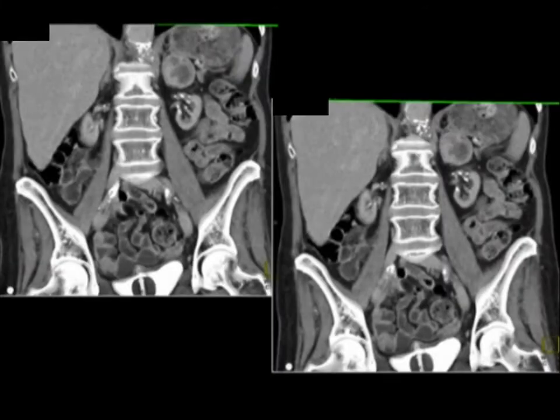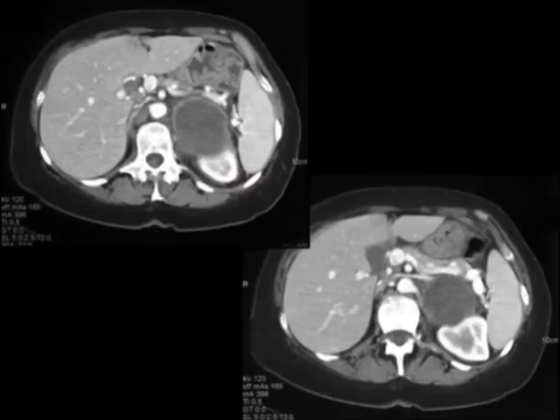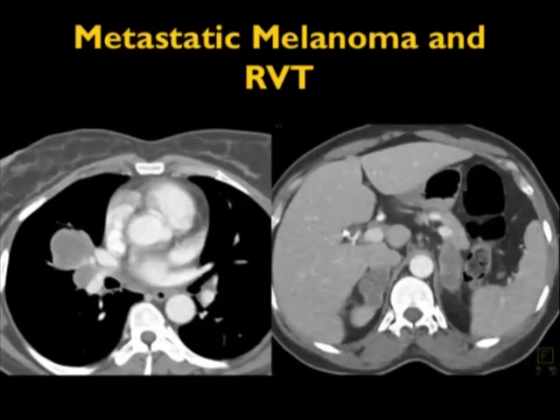Metastases can have some vascularity. They all have some vascularity. But as I mentioned, renal cell is where you have marked hypervascularity. You can see just the appearance. In a patient, we talked before about incidentalomas. This doesn't look like an incidentaloma, but with a patient with lung cancer, it's going to be metastasis till proven otherwise. Mets can be very cystic.